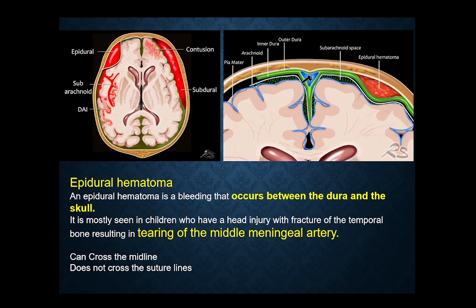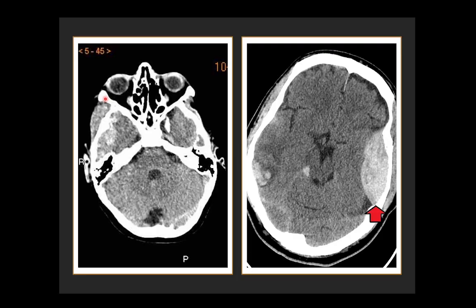Okay, now in this axial CT, again I'm using the word hyperdense. Hyperdense means, if I'm comparing with the brain, it has more density. In CT, there are density differences. So if I measure the density of hemorrhage, it is somewhere around plus 50 to plus 70.